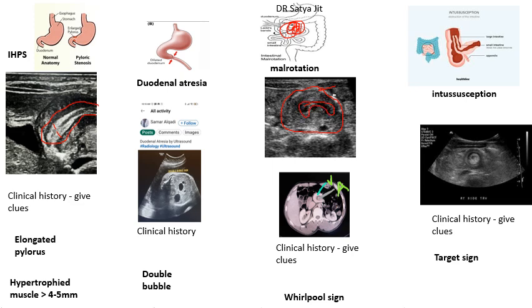Now you can make out this is the vein and this is the artery. In the CT, after giving contrast, within certain seconds they note the arterial phase and another few seconds they note the venous phase. That's how they are able to tell, though both will have contrast, this is the vein and this is the artery. They are curled on themselves. This is called a whirlpool sign.